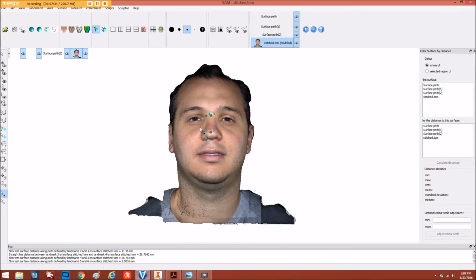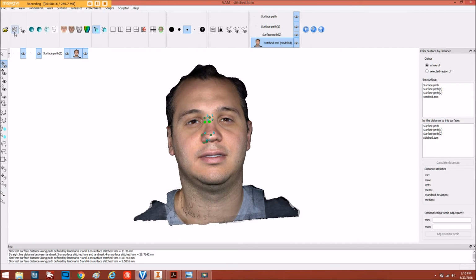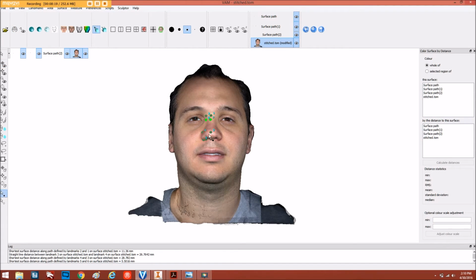Then you go back here, let's say you have a landmark. You're going to put another landmark right here. Selected those two. It looks like maybe the interior one's higher. Yeah, so you want to avoid that. You want to have them at the same height. So we're just going to move this one, and going to move it back here. Front. And it's not in the midline, so put it in the midline.